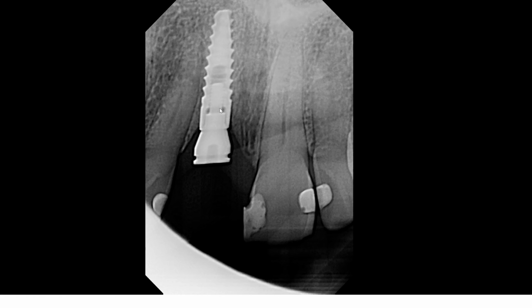But since it moved in the opposite direction, such that the implant appears to be moving more distally toward number 7, that indicates that this implant is relatively buccally positioned within the alveolar process. Anyway, that's besides the point.